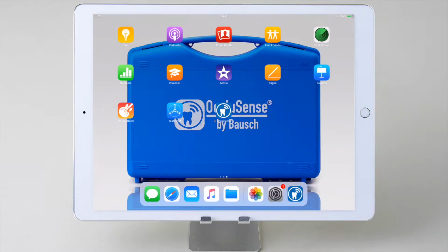Registration of the system. Before you register your system, make sure you have an internet connection. We recommend to register your system immediately to ensure access to the full functionality and extended use. If not, your system automatically returns to the demo mode after 14 days. Nevertheless, no recorded data will be lost.